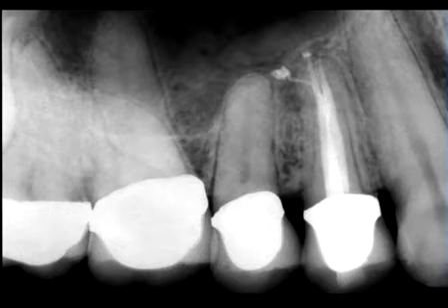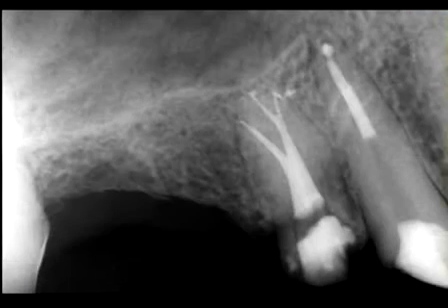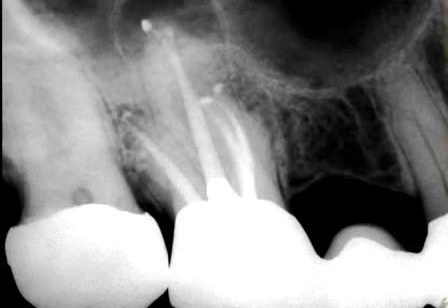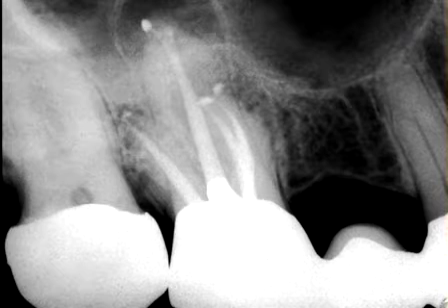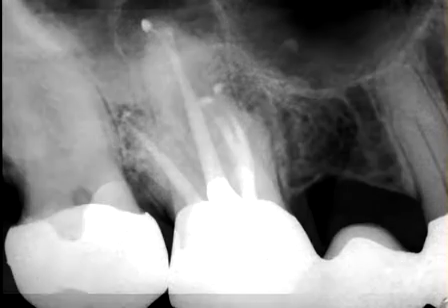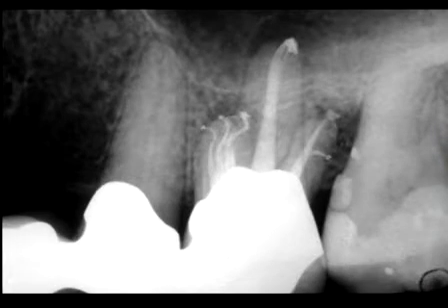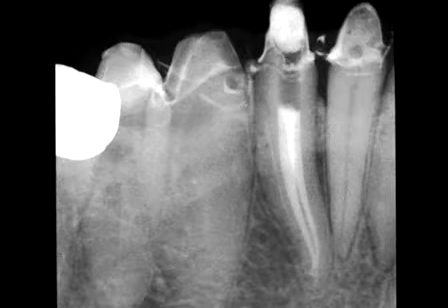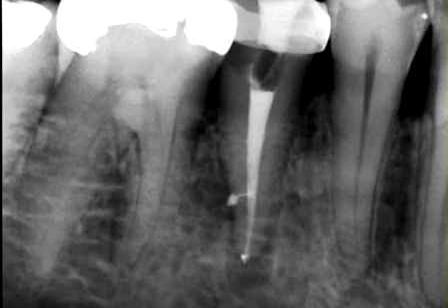Every dentist could pack in 3 dimensions if they had the shape. The desired shape produces a 3-dimensionally cleaned root canal system that every dentist can pack effectively. A fundamental law of physics states only one mass can occupy the same space at the same time. Shaping serves to remove all contents from the root canal space and creates the opening for 3-dimensional obturation.